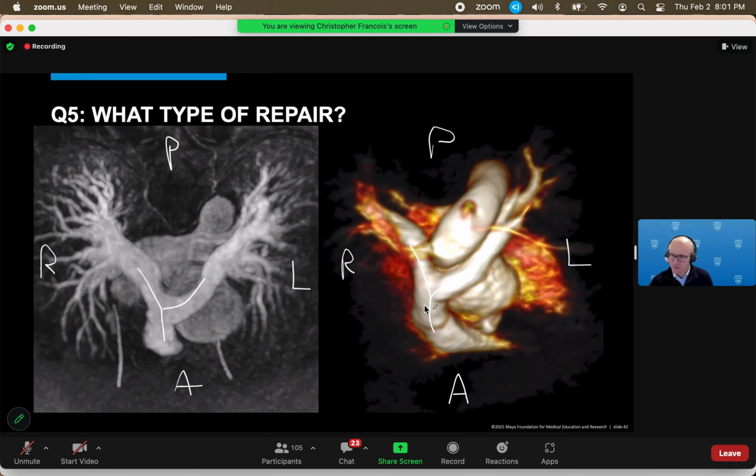So this specific configuration where they place the pulmonary arteries over the front of the ascending aorta, that's called the LeCompte maneuver. So this is part of an arterial switch operation for patients with detransposition of the great vessels or arteries.